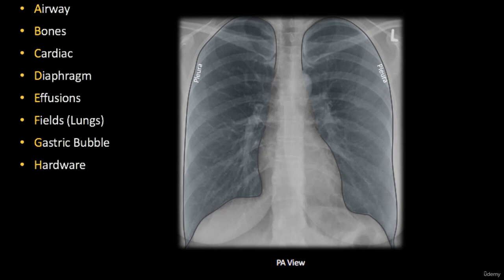And have a look, we have no space between the lung itself and the thoracic wall. They are absolutely adjacent. We have the layers of pleura there, but they are invisible on the X-ray. Any contents, like air around, are an indication of pathology. We also look at how symmetrical the lungs are, sandwiching the mediastinum in between, in the center. Any deviation here will indicate pathology.